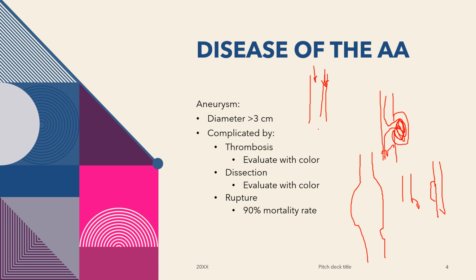And that pressure into the false lumen can cause that aorta to continue to dissect farther and farther as it goes. Now, when you have that dissection, again, this is going to cause stasis of blood flow, and so these areas are more likely to have thrombus as well.